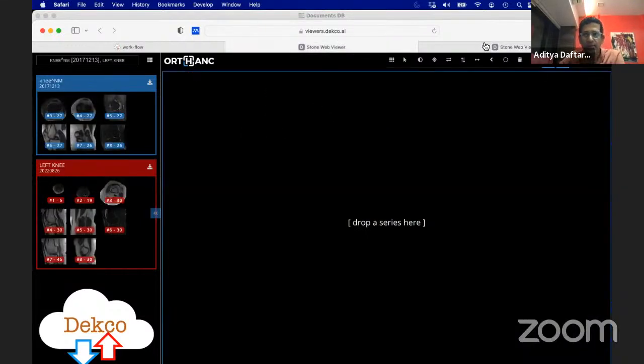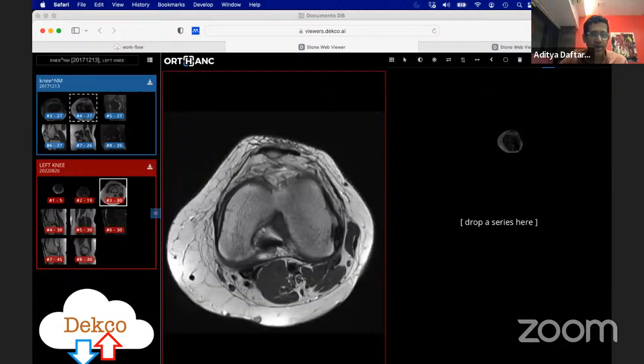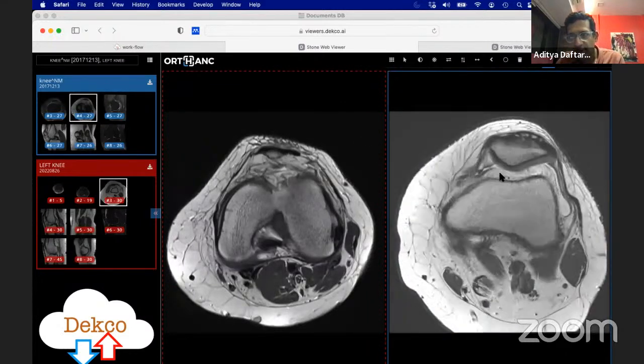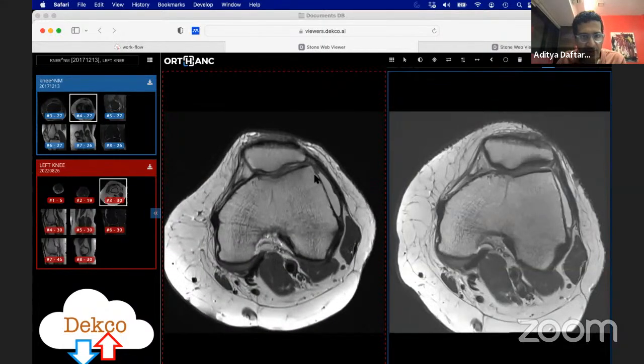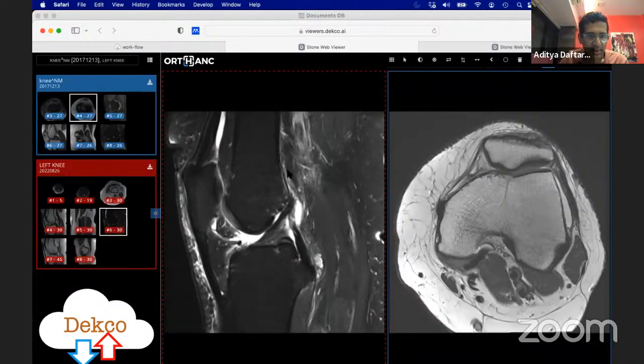Now, here's another interesting case. We have this case here. This is 8/26/22, and this is 2017. Again, this is a case where we look at this, just trying to figure out which exactly thing we saw here.